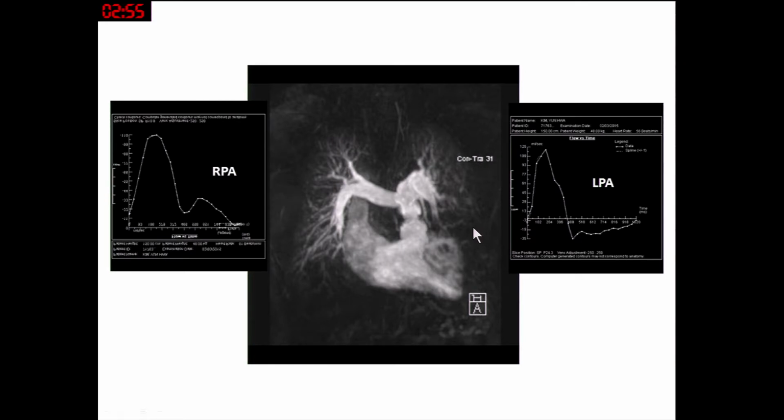So sometimes I call this a unilateral pulmonary arterial hypertension, but I don't know if that's a proper terminology or not, because the pulmonary artery pressure actually measured in the main pulmonary artery comes from a complex combination of both pulmonary artery pressures. So I don't know why, but I can find many, many cases with these findings. I'm now analyzing the data. So this is a good example of what MRI can do. And actually, we can do some segmental artery analysis, and maybe we can add some pulmonary vein flow analysis.